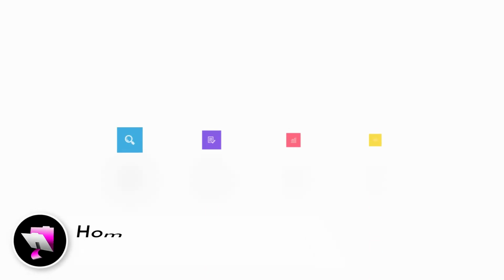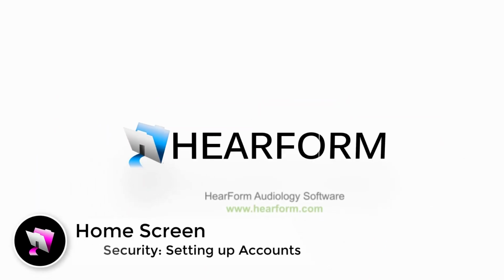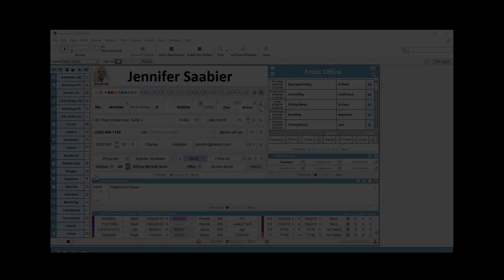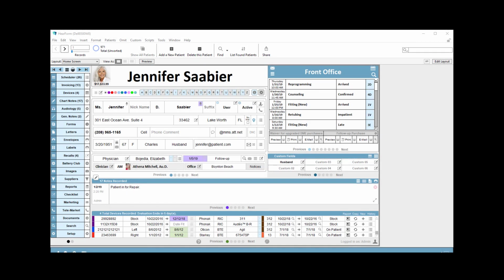Welcome back. This video will explain how to set up account names and passwords in the security area of HearForm Pro. In order to set up account names and passwords, in most cases you're going to have to contact the support of HearForm because we'll need to help you with that.